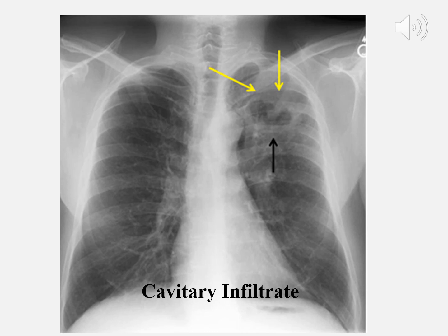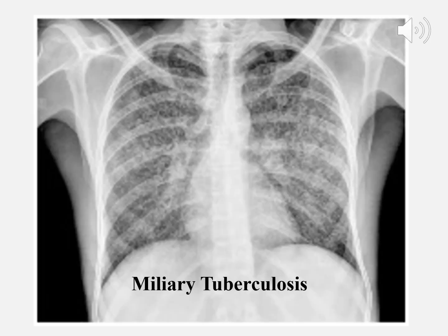This may be a little advanced. You may not need to know this yet, but it's just a good slide and something to learn. Miliary tuberculosis. I've probably seen this twice in my life. I think I've been in nursing for 18 years. I've seen this twice in 1 year. So this is miliary tuberculosis. This is what it looks like. Know it so you can recognize it just in case.